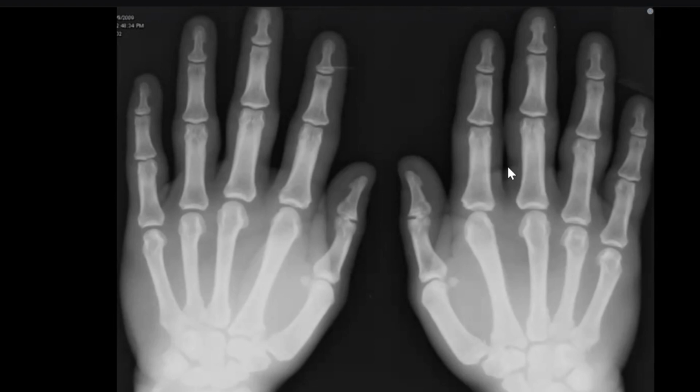the metacarpals, which is reducing the medullary cavity. It is predominantly involving the proximal phalanx of both hands as well as metacarpals. So cortical thickening is also there. But sir, there are no erosions seen in this. Sir, I want to ask about the history of the patient, about thyroid profile of the patient, as well as any previous X-rays.